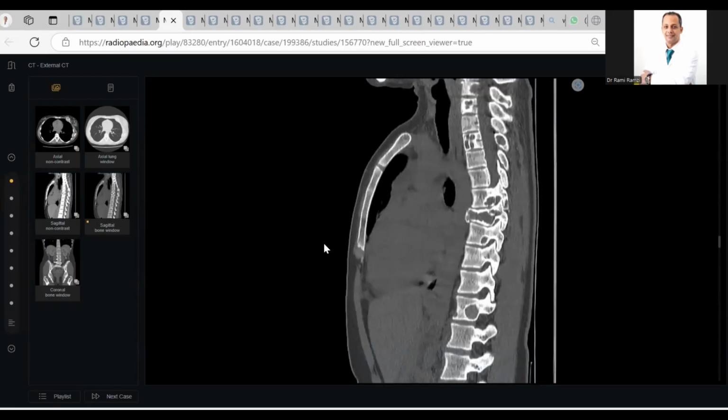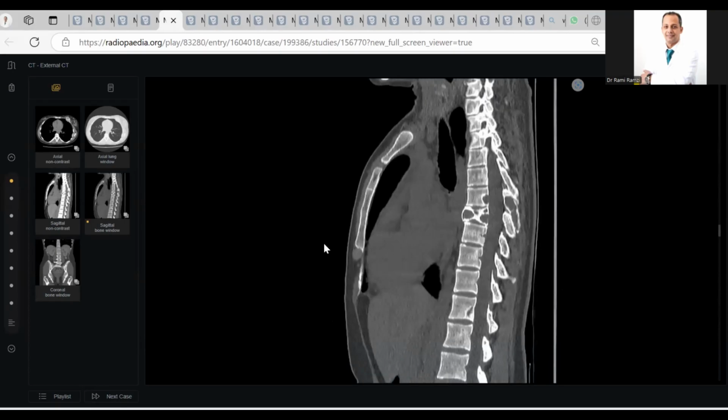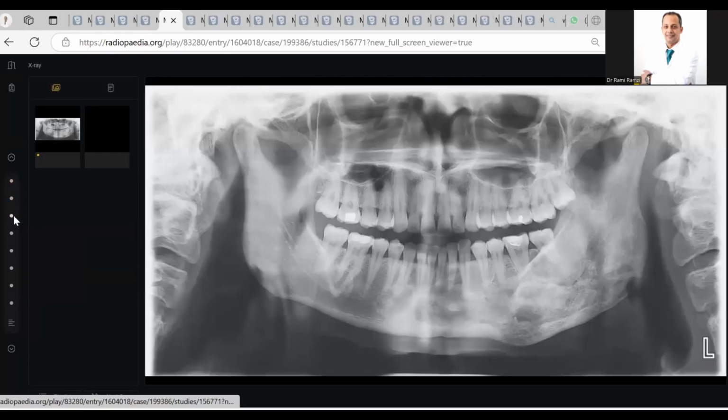So in the patient with a breast cancer, this is likely suggestive of metastasis involvement of the multiple bones. So I will inform my finding to the referral physician. What will you do next? In my routine practice I will look at the lung if there is involvement of the lung and metastasis to the lung.